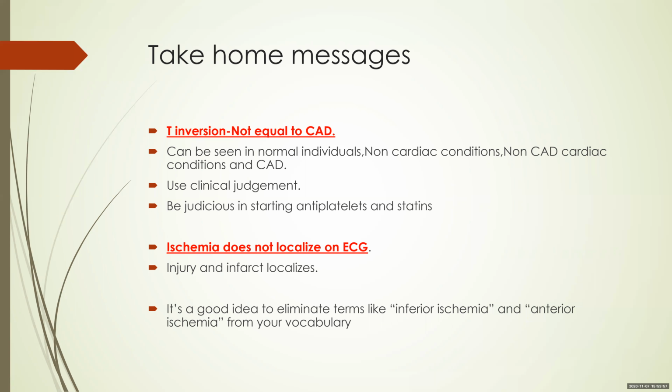Ischemia does not localize on ECG. T-wave inversions and ST depressions do not localize. Injury and infarct localize. That is, ST elevation and a pathological Q wave do. It is a good idea to eliminate terms like inferior ischemia and anterior ischemia from your vocabulary. Try to avoid these terms.